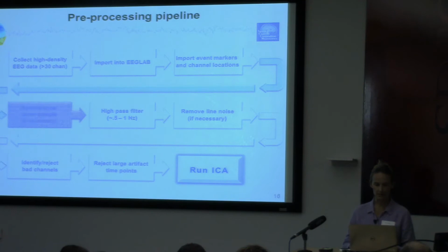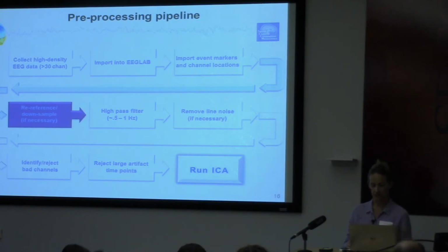All right, next step is re-referencing or downsampling, and this is just if it's necessary. Oftentimes this re-referencing happens right when you import, and downsampling is definitely not compulsory. It's just if you had like 2,000 hertz, and you just don't have the memory for that.